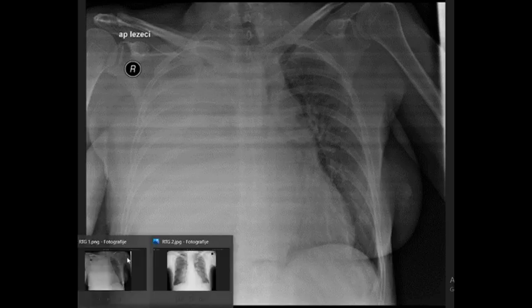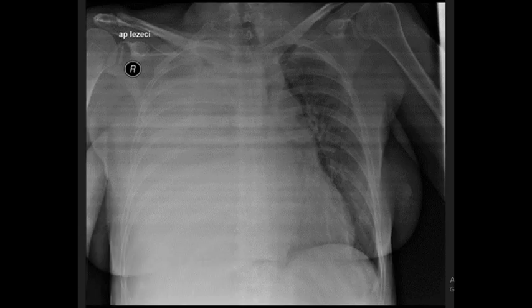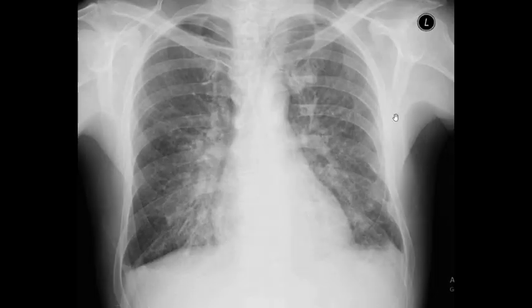So, as I said, in the course of time, analyzing many X-ray examples, the eye gets accommodated. And that is a very important thing in becoming more professional, besides having this basic knowledge in analyzing different X-rays.